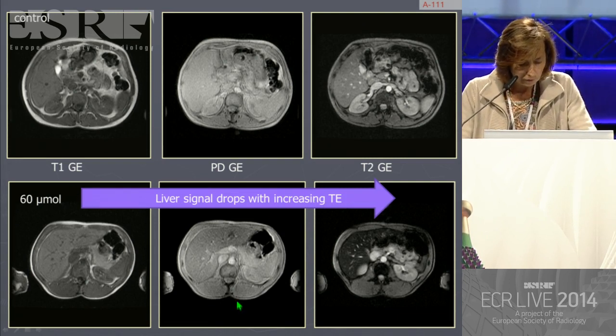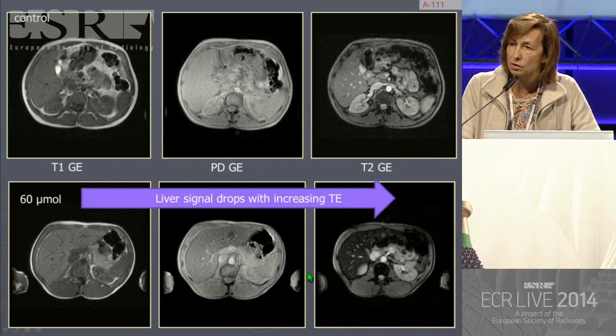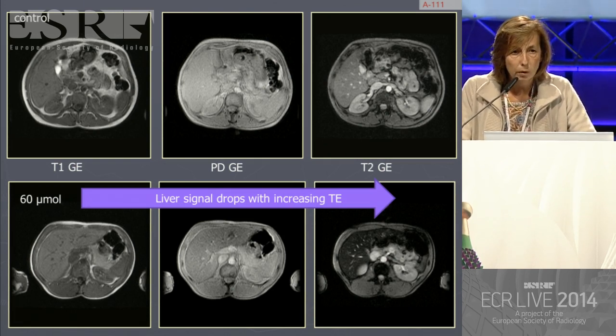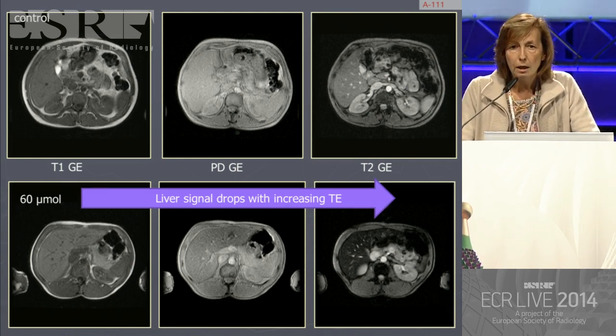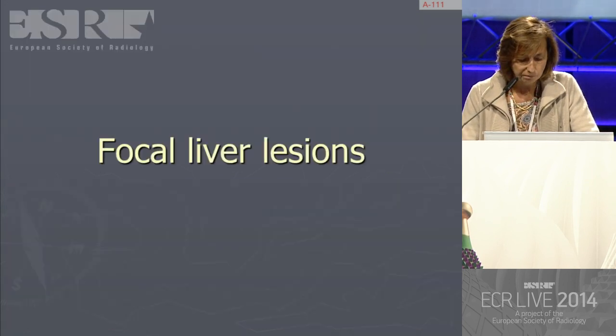So our patient definitely had an iron overload, and this explains why MR is so sensitive to depict iron overload, and we can not only diagnose, but surely very well quantify. Sometimes steatosis and iron can be associated, and diagnosis of such a combination requires multi-echo sequences with in-phase, opposed-phase, and with increasing TE values.